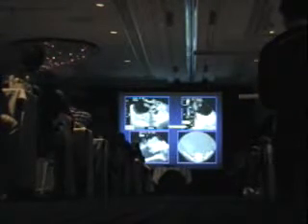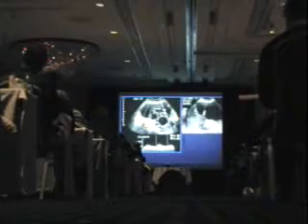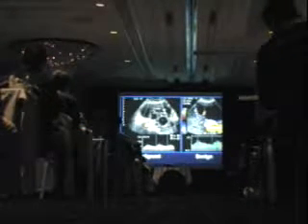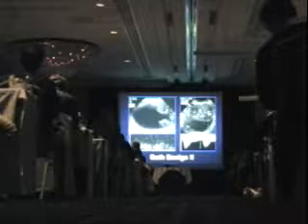Just looking at a few examples here. Very big masses. They have disturbing Doppler flow. Malignant, not surprising, but they're big. You want to see them beforehand. What about this? Septated lesions, both with lots of flow in diastole, okay? You can't tell. They're both going to come out. In the final case here, mural nodules, a lot of ugly-looking stuff there, lots of flow, both benign.